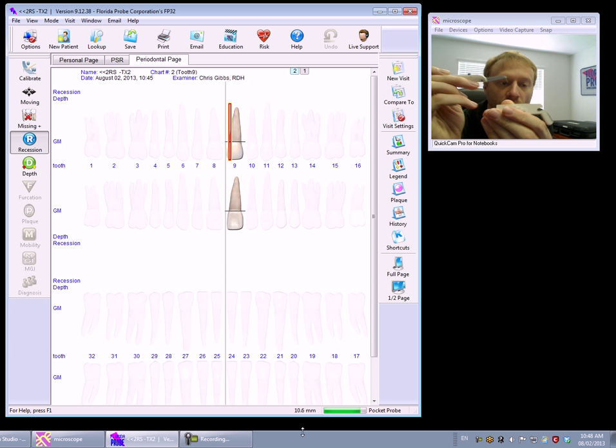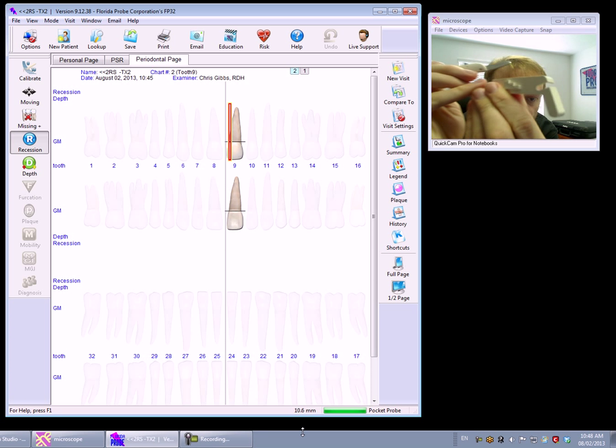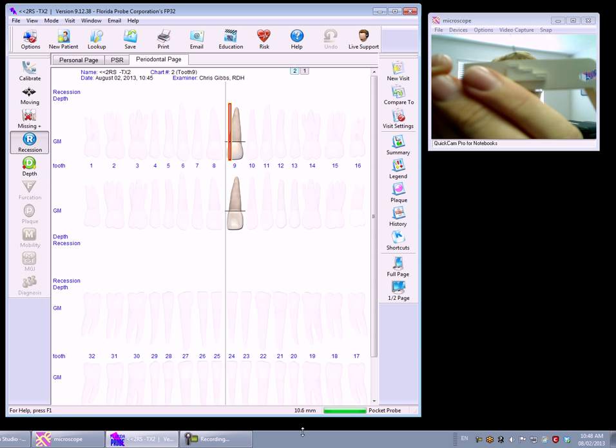So if you want to actually measure 3 measurements, the back of your tip protector is marked with a 3, 6, and 9 stair-step measurement.